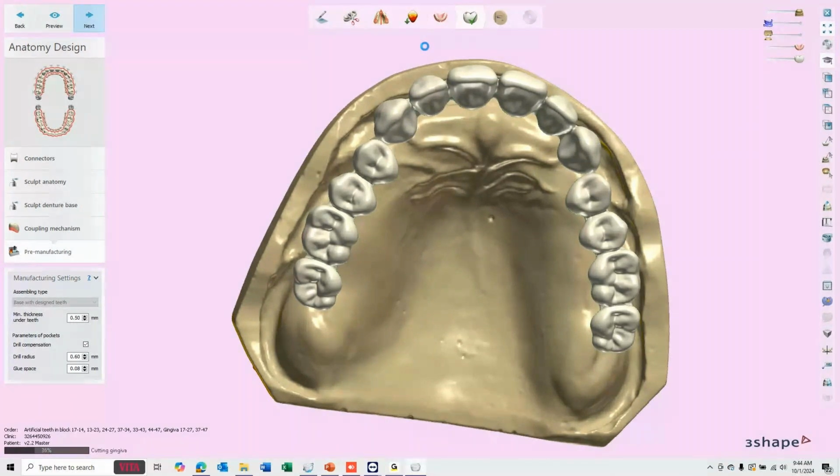It doesn't actually export that to the mill, so you still have to nest it at the mill. It's more of a preview than anything else. But again, sometimes it helps when you're nesting. Like I said, if you had done this as a roundhouse and you couldn't get the whole thing in there, then you could always jump back and split it into 3 pieces like I did it, or something like that. That is how I would use that piece of it.